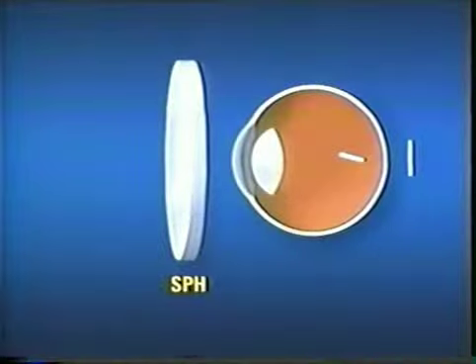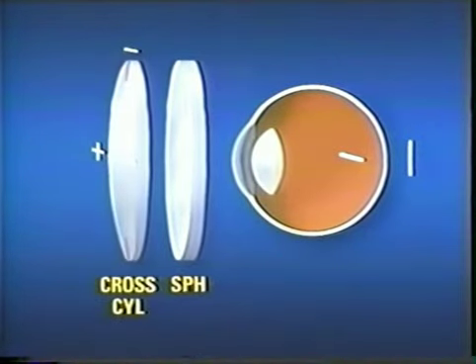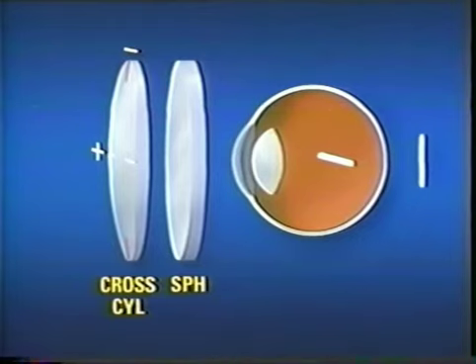With the focal lines now straddling the retina, the cross-cylinder is introduced with its axes aligned with the principal meridians of the eye's astigmatism. In this flip position 1, the plus cylinder, axis 180, pulls the horizontal focal line farther forward, and the minus cylinder, axis 90, lets the vertical focal line slide farther backward, increasing the amount of astigmatism and thus increasing the blur.